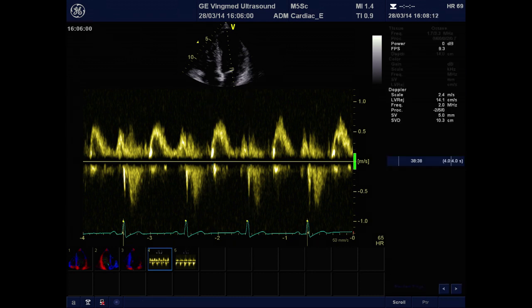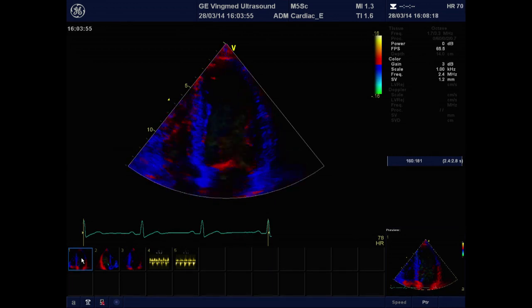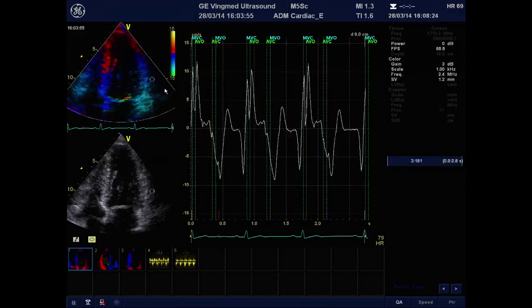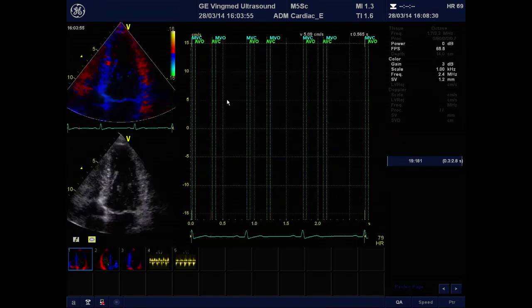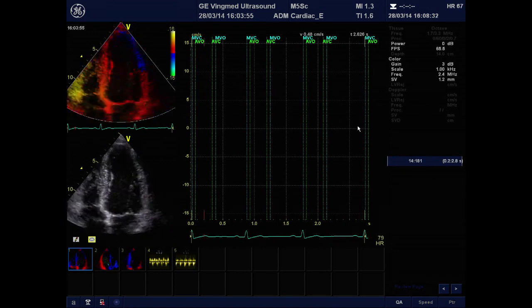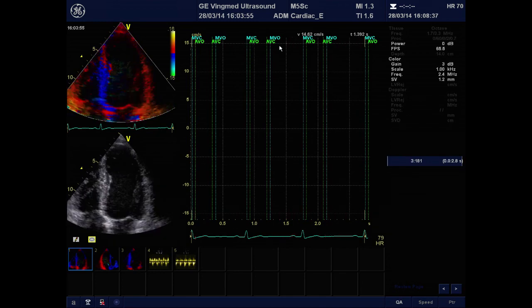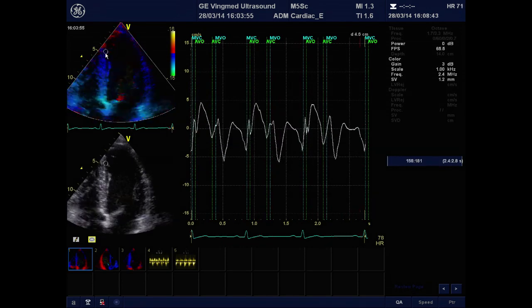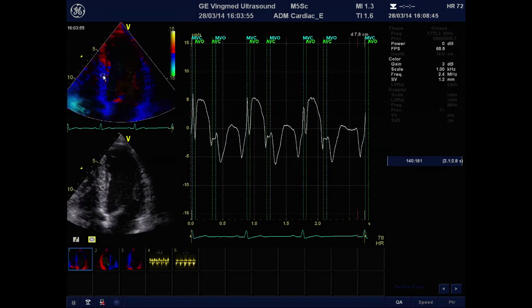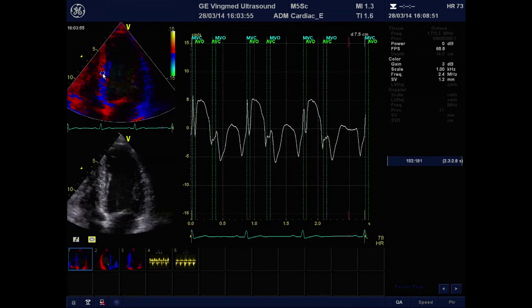And now we are ready for analyzing tissue Doppler data. Depending on the machine, you will find different programs. Here you see one of these programs, and what you can see here is the loop we acquired a few minutes ago. You see already the timing implanted into the display for the curves. So we know already when the aortic valve is opening and closing and when the mitral valve is opening and closing. And we have a lot of tissue Doppler data now from all the image, and we can go with our mouse through the image and see how the tissue Doppler signal is changing.